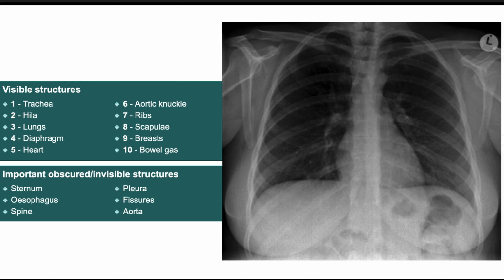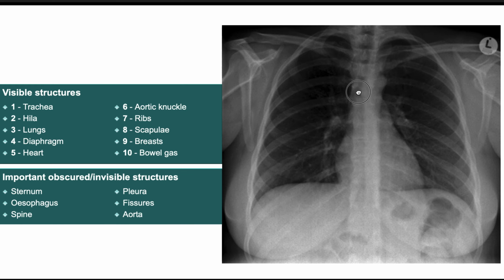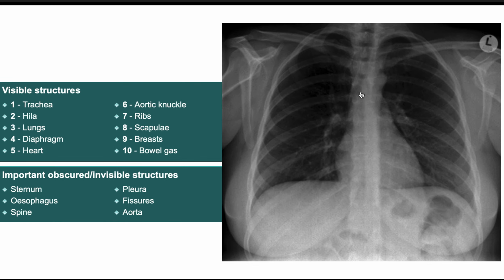So using the stuff on the left, we can identify the trachea. For the trachea or the bronchial region, we can go straight in first and look for the trachea. We can see the trachea is filled with air because air goes through it, so it should appear lucent, i.e. it should appear black. Behind the vertebral bodies, directly behind the spinous process, you can see a black tube coming down, and usually it splits somewhere around the carina into the left main bronchus and right main bronchus.